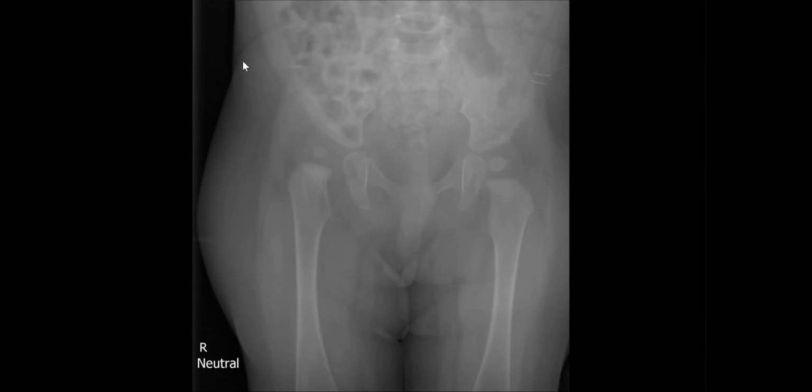If I want to further explain it, there is disruption of the lines. The other line is transverse, going through the upper margins of both acetabuli. This is the horizontal line, Hilgenreiner, and the vertical line, I think, is Perkin's line. It's a little bit superior and outer as a location.